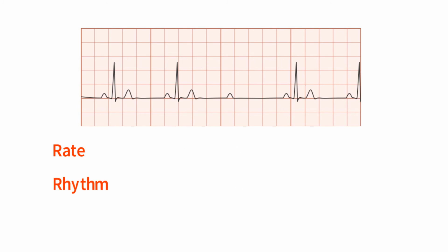Let's check the other thing in the rhythm, which is the P wave is upright. Yes, it's upright here, and this is lead 2, so it's normal here. And the other thing, is every P wave followed by a QRS complex? In the first wave, yes, a P wave, then QRS. Second wave, yes, P wave, then a QRS. Third wave, a P wave, but no QRS after that.